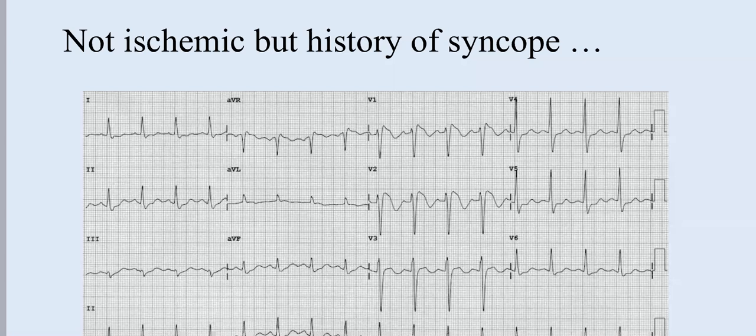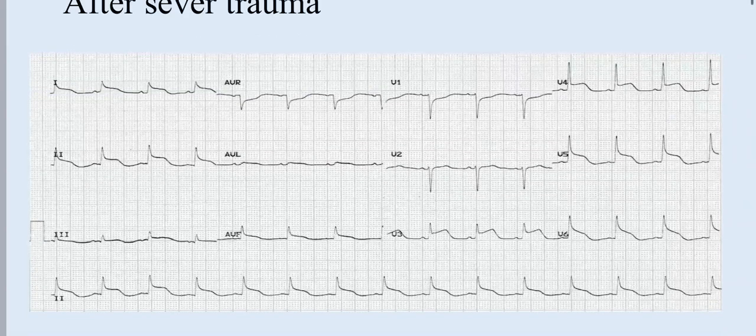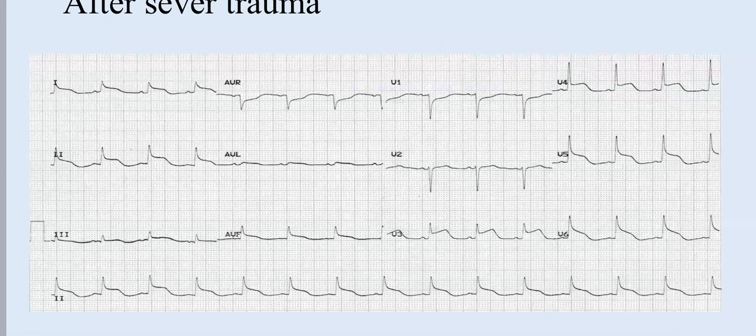Okay. Now, this is my masterpiece. This is a patient with an ECG after trauma. What do you think first? If I ask you to describe this ECG, what do you think about it? Just descriptively.